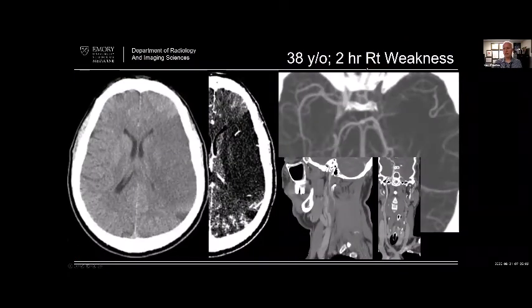Different patient, different case, young patient. Definition of young is your age or younger, no matter what your age is. So young patient to me, 2 hours of weakness. You can see on the non-contrast head CT, you can see the infarct already. CTA source images with stroke windows, you can see a little bit of sparing at the stem, presumably. But most of the stem is occluded there. And you can see this patient has an arterial dissection, long segment, smooth, flame-shaped narrowing going up through there.